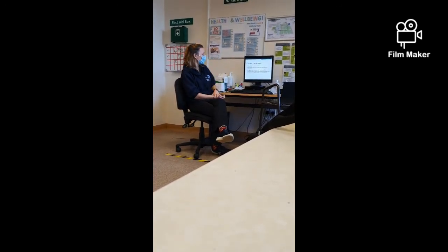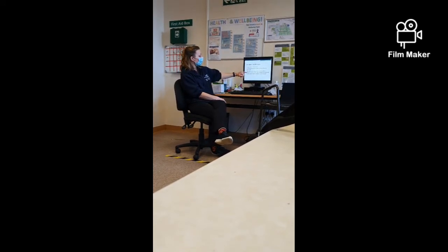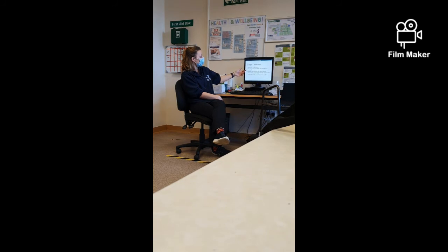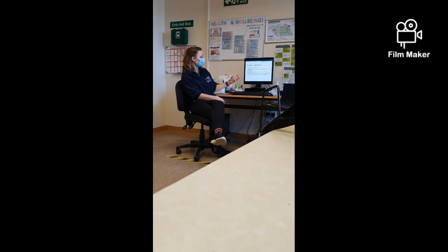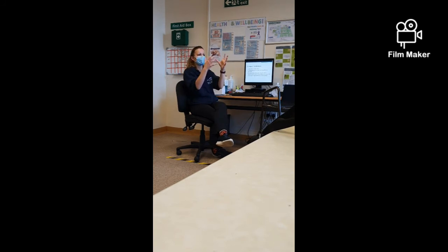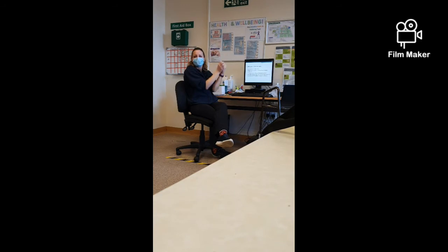So yeah, collapse: there's a loss of air, which is the white areas. The diaphragm could be raised, but it was very difficult to see because it was white. And in an upper lobe collapse, the trachea is deviated, and in a lower lobe collapse, the heart's deviated. So if it's a full collapse, it's both deviated, okay? And it's towards the area of collapse. So if you just think, it sucks it all across, because there's no air in it. Can I ask you a question? Yeah. If you've just got a lower lobe collapse, yeah.